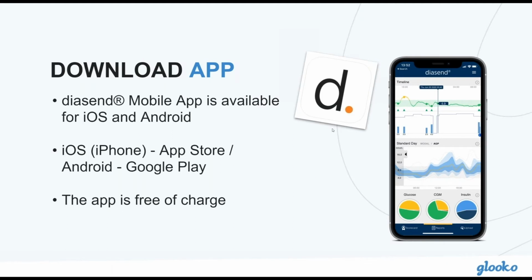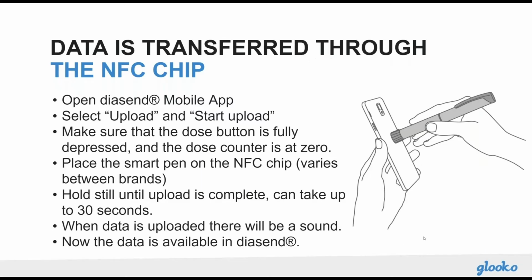You can see the diasend app icon here displayed on screen, and we have a visual of the reports and some of the data that is available once they open that app. Once they've uploaded their device data, you'll see that they get a mixture of continuous reports here, pie charts, and other useful information to really give them greater insights into their diabetes management.